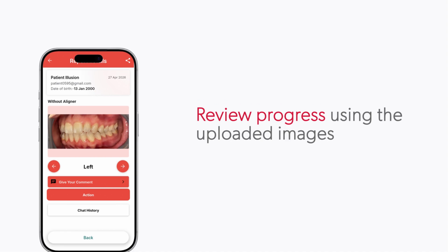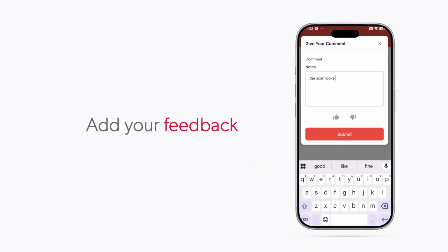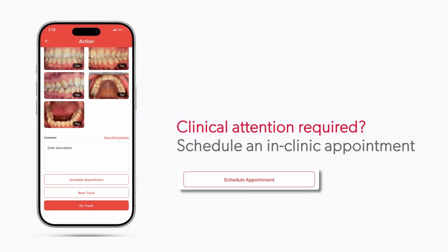The dentist can easily review the patient's progress using the uploaded images. The dentist adds personalized feedback directly to the report for the patient to review. If something requires clinical attention, you can quickly schedule an in-clinic appointment. Click on Action and select Schedule Appointment.